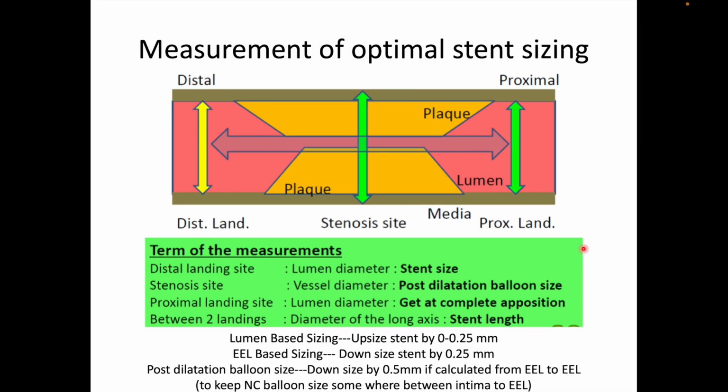So how do you optimally size your stent? So at the distal reference segment, you go from intima to intima. That's the lumen.